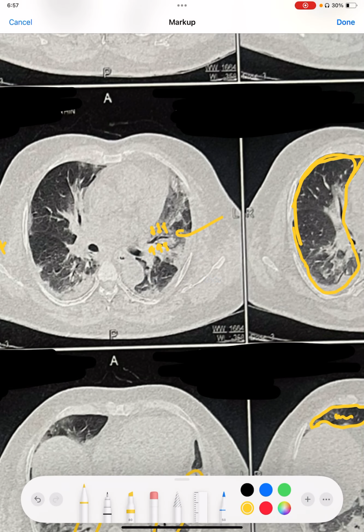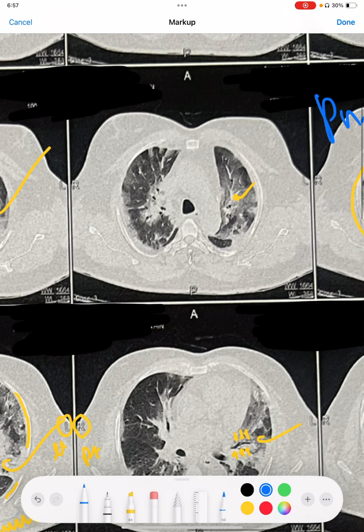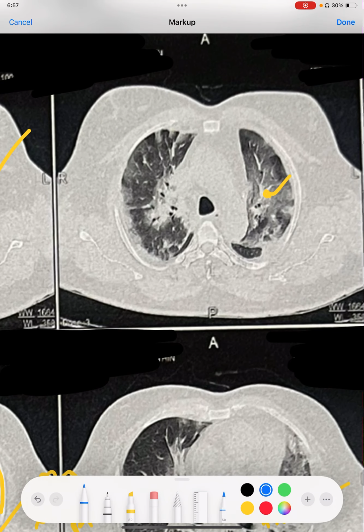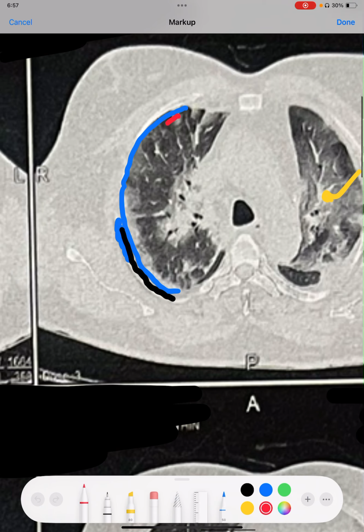There is one more interesting thing in this HRCT chest. If you see the presence of these patches, there are so many patches which are subpleural based. So this is the lung. This is the pleural margin of the lung, because outside the lung we have pleura, and outside the pleura we have the bone, this rib. This is the rib margin. So we have a pleura and then we have lung. So this is the lung margin, this is the pleural margin, and this is the rib margin.